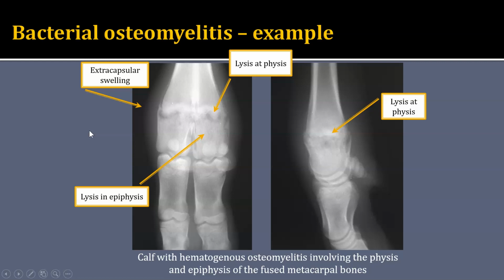So you might have noticed that the calves seem to produce a lot of new bone, especially that femoral fracture that we saw, whereas adult horses oftentimes have very little periosteal proliferation. And then the other species and other ages are kind of in between.